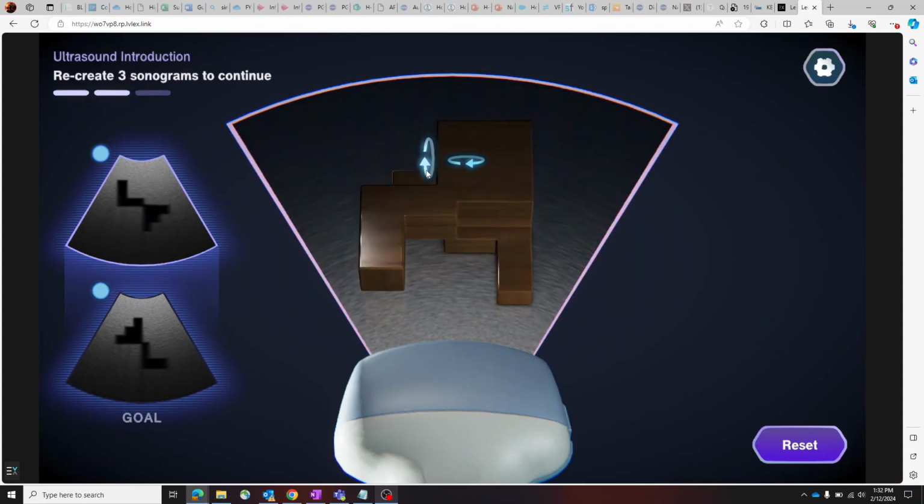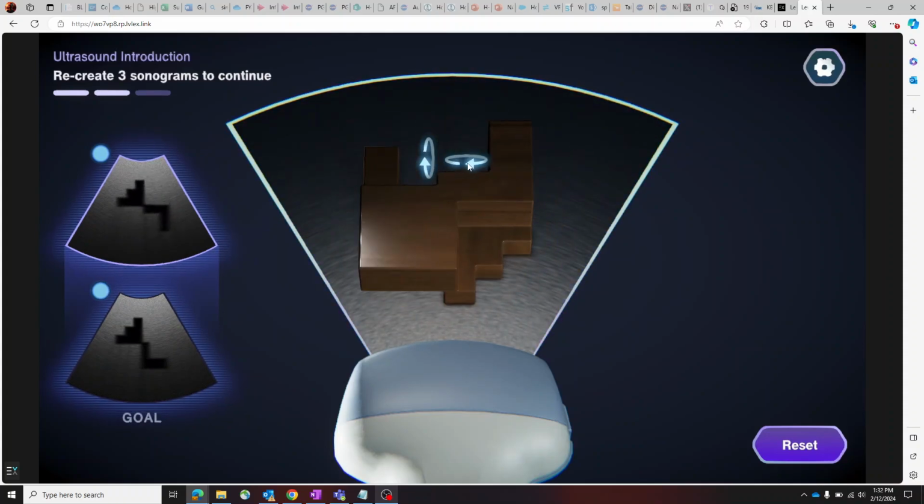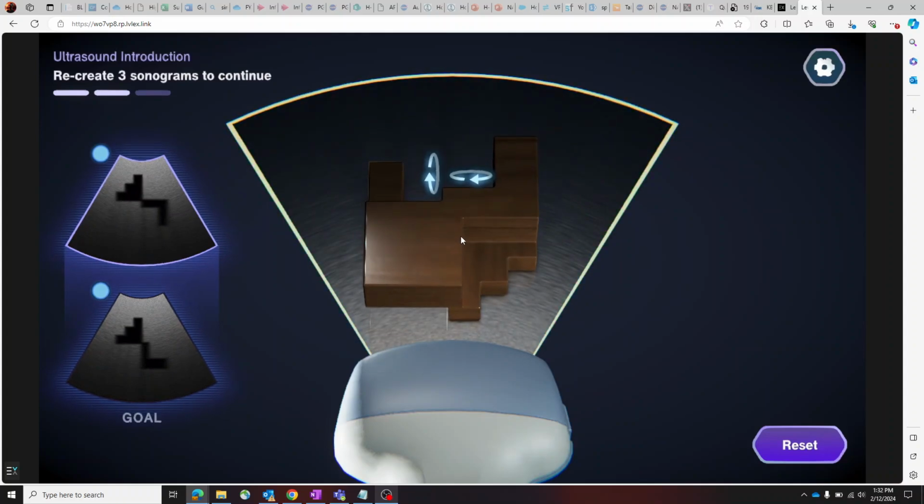Like there, you can identify the crown on the rook. It's all about finding the right angle to view it from.